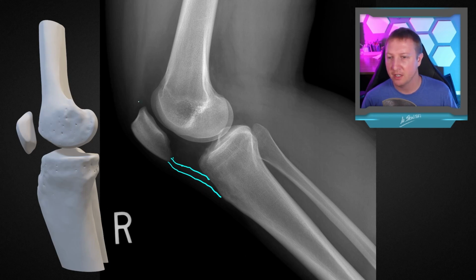And when you do that, then you also kind of string the quadriceps tendon away here so that we can get a good assessment of this kind of suprapatellar region to see if there's a suprapatellar joint effusion. And so like we can see in this case, we'd like to see a little collapsed area of fluid density within the suprapatellar fat to tell us there's no distension of our suprapatellar recess or bursa. And if our knee is too extended or too flexed, then it makes it much harder to assess for that, and that's an important secondary sign of trauma or other causes of joint effusion that we need to be sensitive to detecting. Okay, and so in this case, of course, it's not distended.